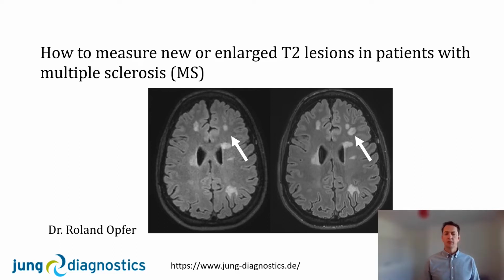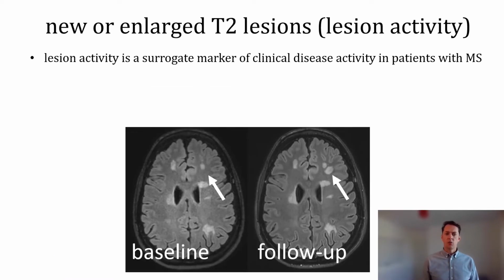In this video, we will explain how to correctly measure new or enlarged T2 lesions in patients with multiple sclerosis. If you want to avoid a common pitfall measuring new or enlarged T2 lesions, then you should watch this video. Why are new or enlarged lesions important?